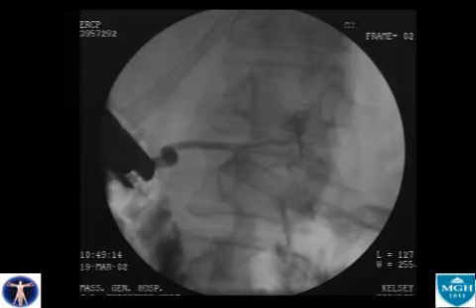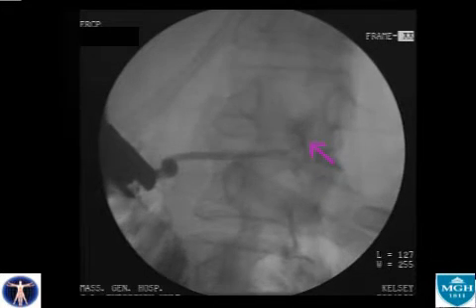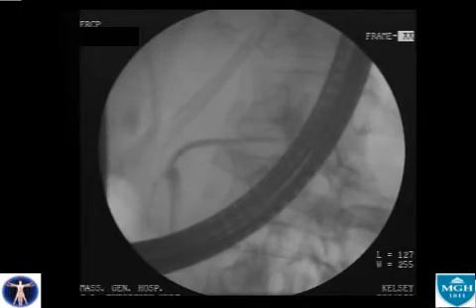duodenal lumen. The second patient had recently undergone a resection of a cyst adenoma from the pancreatic body. In the immediate postoperative period, high output drainage was again seen from one of the surgical drainage catheters. ERCP demonstrates a fistula into the mid-pancreatic duct. Contrast does not fill the tail of the gland, thus we cannot determine if this has been a complete transection of the duct or simply a small defect in the wall.